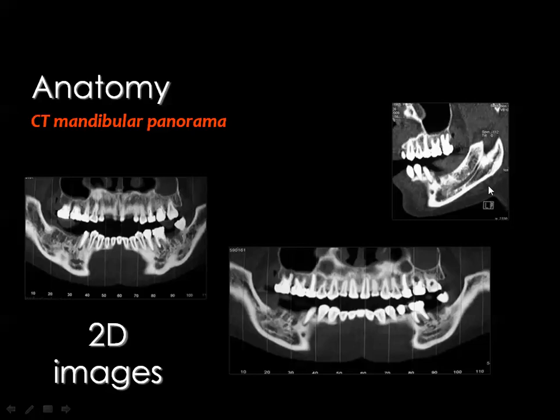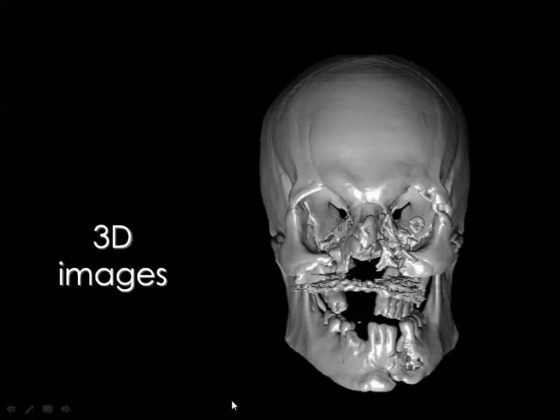And also you can have the CT panorama, which shows more detailed anatomic structures obtained by CT compared to those obtained by the plain X-ray. Then you have the facility to reconstruct the images in a 3D fashion or manner, and this is extremely valuable, as I have mentioned before, in evaluation of maxillofacial trauma in particular.